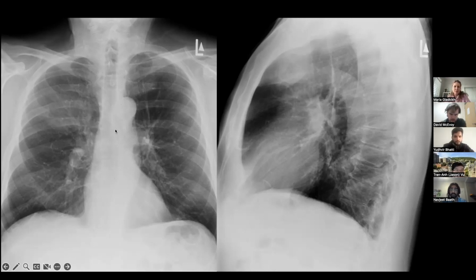I look at the trachea to see that it's midline. Sometimes you can see it a little bit deviated, and that's completely normal just because the aortic knob is sitting there, so it can push it a little bit. So don't call it a tension pneumo, for example. And then go down to look at the mediastinal contour, the heart contour. You're going to want to look for cardiomegaly, for example. Next, I look at the perihilar structures, just to see if they're enlarged, if there is any abnormality there. And then I zigzag quickly through the two lung fields to take a quick overview, and then I pay more attention to the lung fields, now particularly concentrating on the abnormality, which I see here.